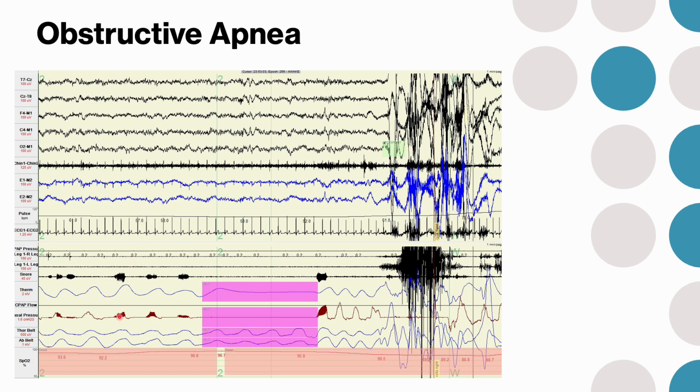And right here, this is the nasal pressure without a signal filter on it. So this is the native signal, and that's what that darkness is there. Those are snores. A lot of labs will use a filter on it so that it'll just be a straight line, but that's taking out the snore artifact, which you can still count as a decrease in amplitude. So that's that.